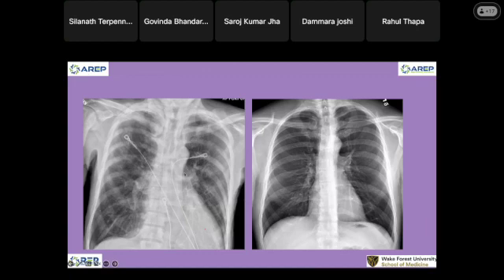We leave the mediastinum alone. Now we look at soft tissue and bones. Our decision and recommendation is based on the clinical context. Is it normal? Are they normal? Soft tissue and bone? Different age group, different management, and different recommendation.